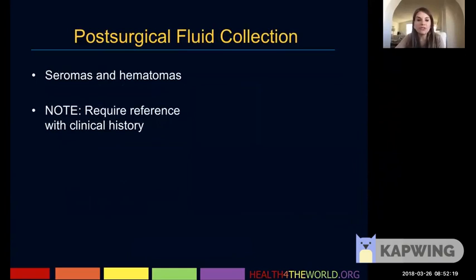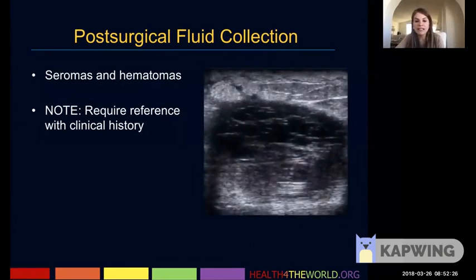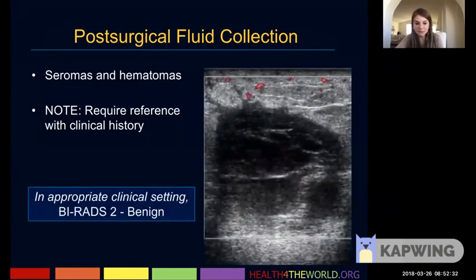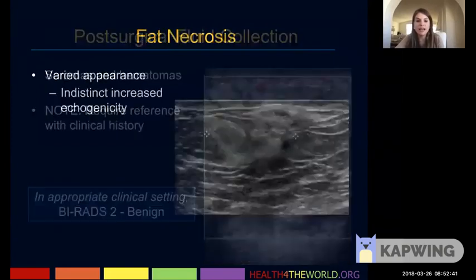You can also have post-surgical fluid collection, seromas, and hematomas. These require reference with clinical history. Again, in this case, this was a patient who'd recently had surgery, and this was just a seroma, to be dismissed as benign. There was no vascularity within this lesion, which we confirmed.